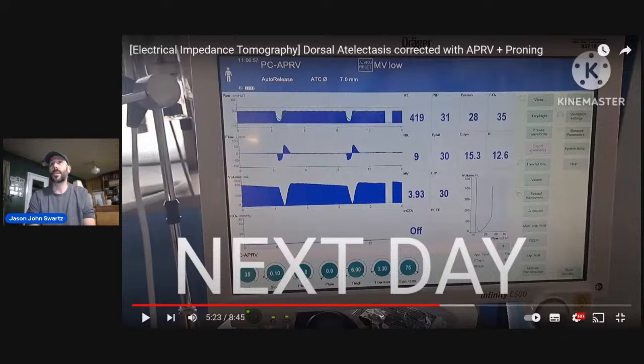So if it was a set, because the Draeger V500, you're setting your peak inspiratory pressure. They had it at 32. They had a PEEP at 8. Okay, so horrible at math. Is that like a delta P of 24? Yeah, 24. Okay, very high.